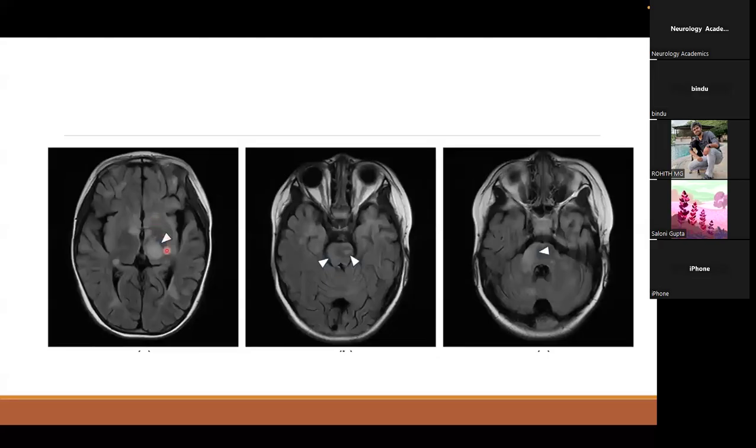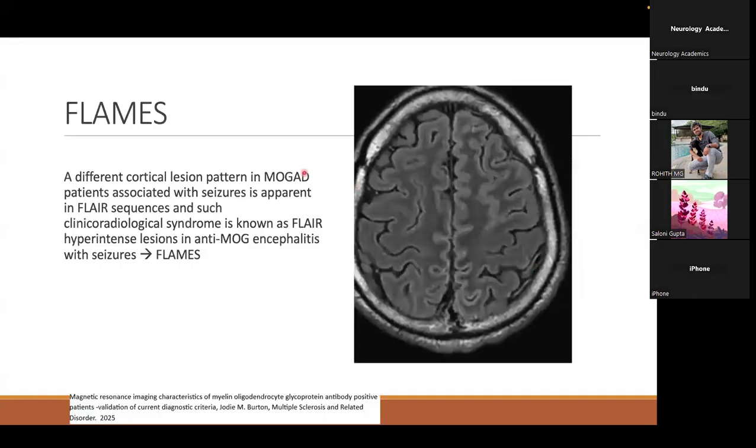asymmetric lesions. These are poorly demarcated fluffy lesions in the thalamus, as well as both the deep gray matter and the subcortical white matter. And here, just adjacent to the fourth ventricle, and not lining it, poorly demarcated fluffy lesions can be seen, asymmetric. Here, involving the middle cerebellar peduncle, a large fluffy lesion can be seen.